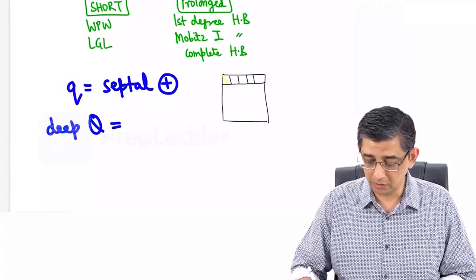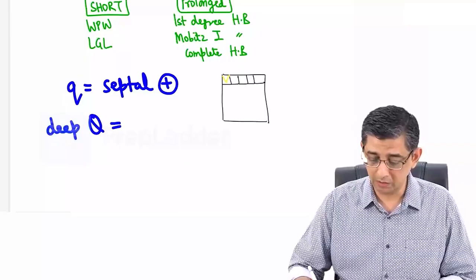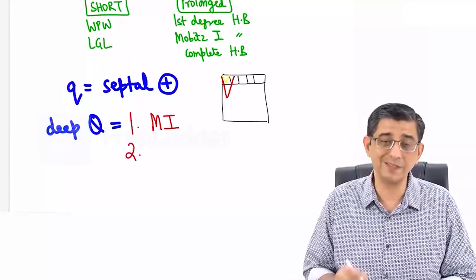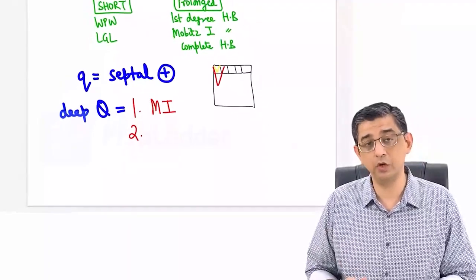Now I'm going to draw a Q wave in slight yellow color. It fits into one small square. Now draw an abnormal one which is spilling out of it. The first condition having this is myocardial infarction. In fact, deep Q wave in MI signifies cell death, and this finding will persist for the whole life of the patient. It's never going to go back.